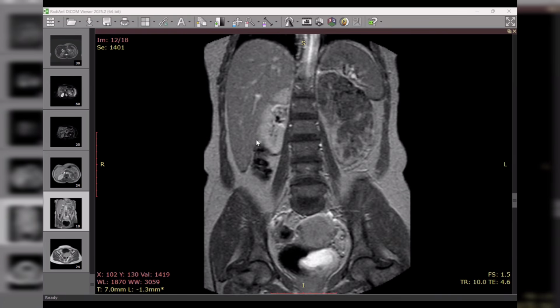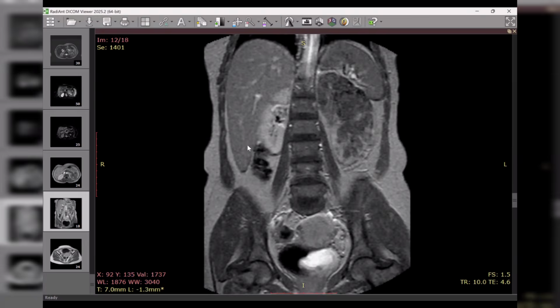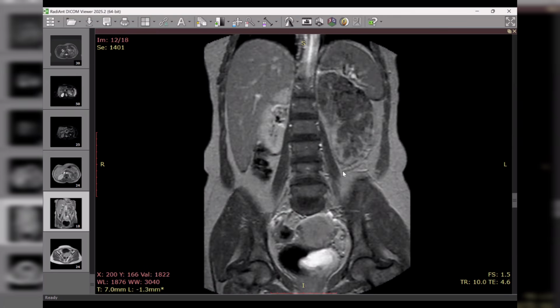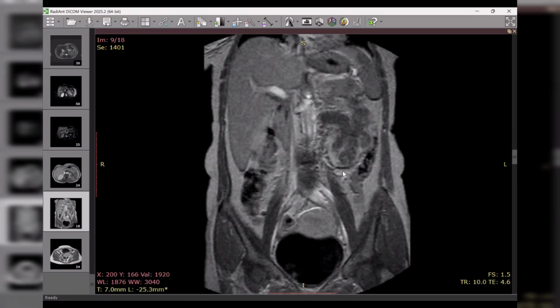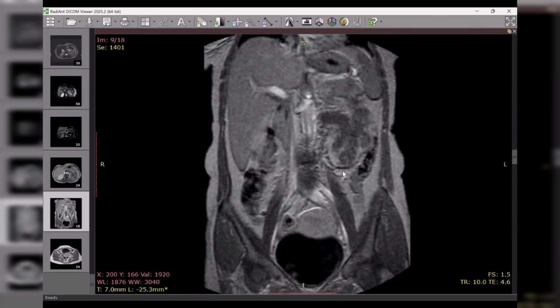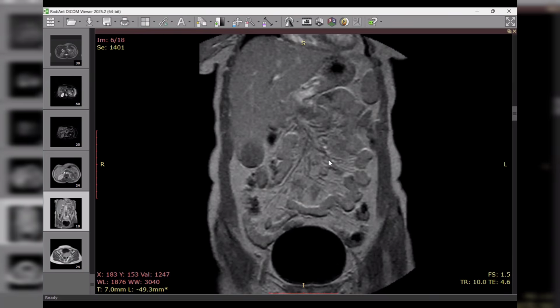Okay. On the post-contrast, what do you think? I think this is an irregular enhancing mass lesion which is extending into the left renal vein. The left kidney also appears to be enlarged. My differential may include neoplastic disease process such as RCC, with other less likely differentials including lymphoma, or less likely metastatic deposits from a previous known primary, because there is also a suspected mass in the right lobe of the liver.